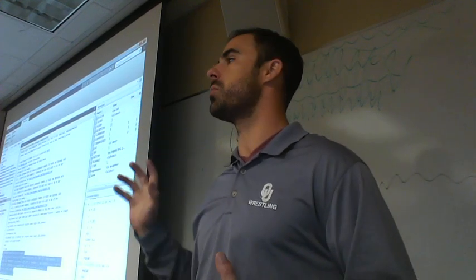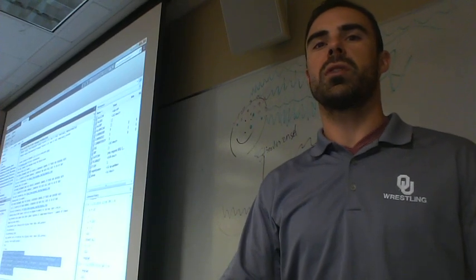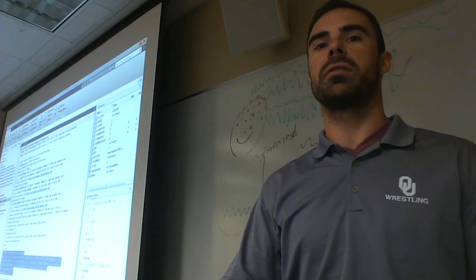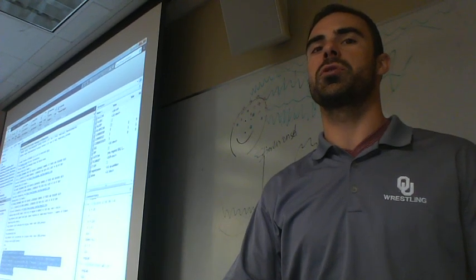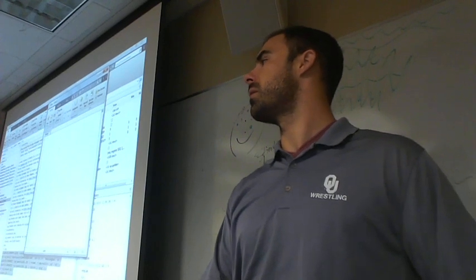Remember I said we're going to use the GUI? But we're also going to learn how this works. So let's go to our Home tab on the left here, and we're going to hit New Script. So Home tab, New Script, click it. It's going to open up this little, looks like a little notepad, okay?